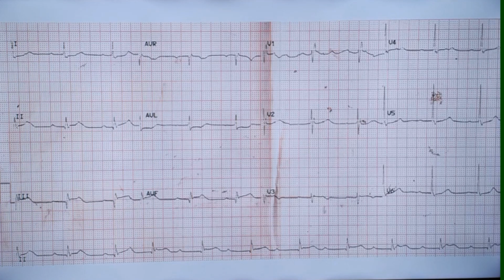Then you have to compare the atrial rate. For that you have to see two consecutive P waves. See this P wave and the presumed P wave here. The atrial rate obviously is much higher than the ventricular rate if you compare these two P waves. So naturally there are other P waves which you do not see. This is probably another P wave. So that this will be the PP interval.